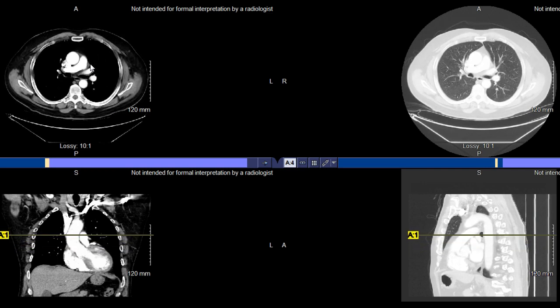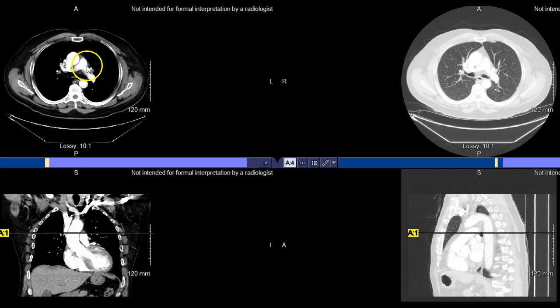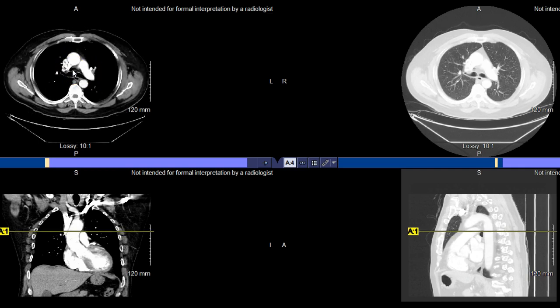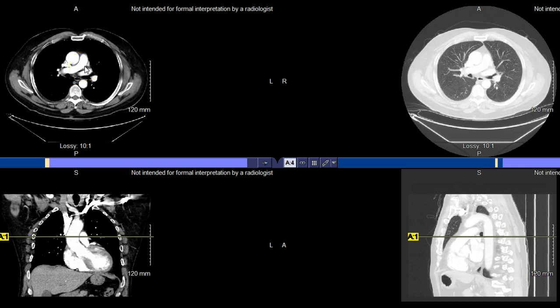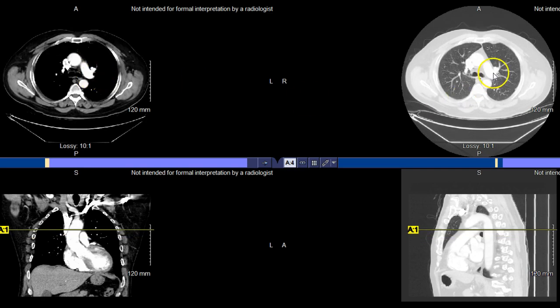Other ideas is the pulmonary arteries. So I refer to this, like I said, as the mustache area. You can see that mustache right there and right here, respectively. So classically referred to as the pulmonary trunk here, and then we can see our right pulmonary artery and our left pulmonary artery there, respectively. So make sure you can label those, differentiate between those structures as well. And you can, yes, subsequently see how they're entering the lungs. You can see the points of where they're going in, what would be classically referred to as the hilum region.